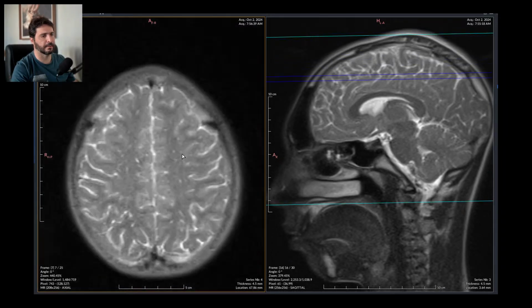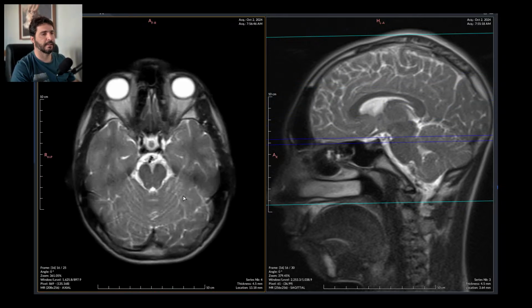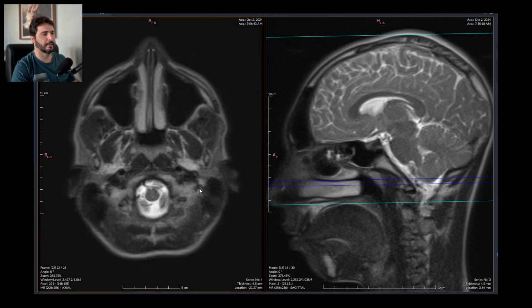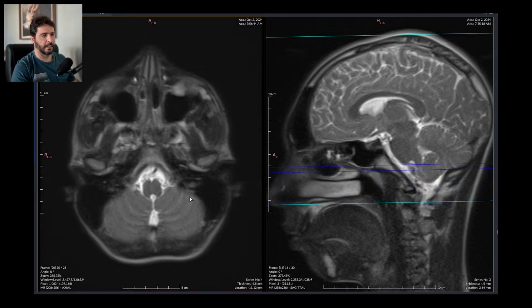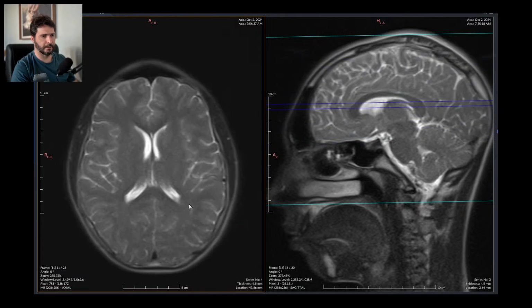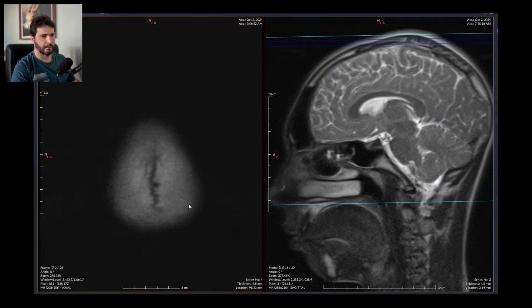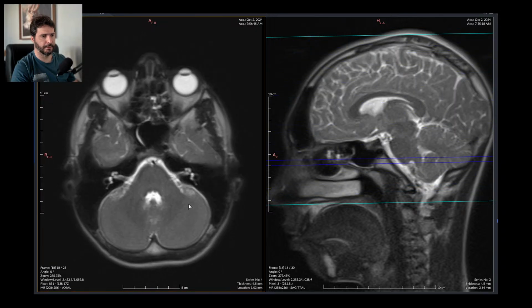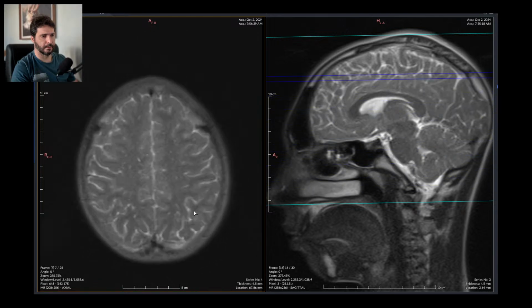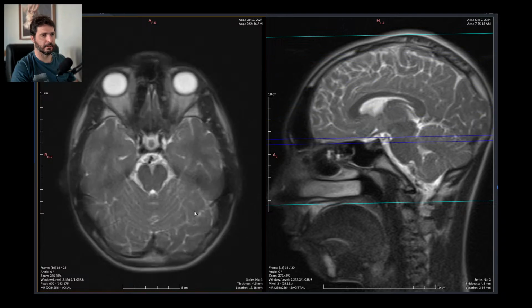Let's grab an axial T2. Yes, very bad old age scanner. It is what it is. It has been done. It has been sent to the platform. I have downloaded it, so I have to report it. Cursing at it won't help me much, so let's just smile and report. Smile and report. It seems fine.